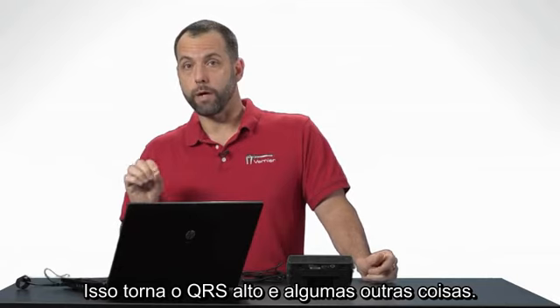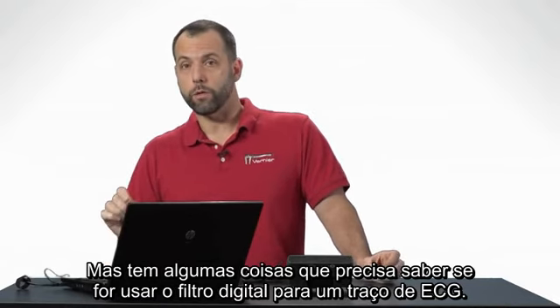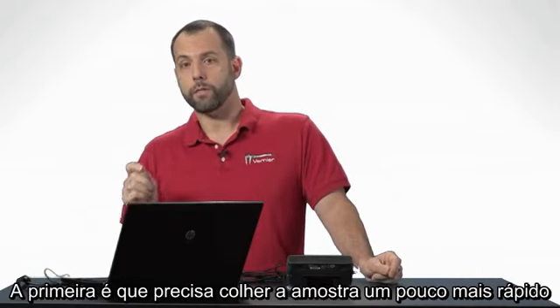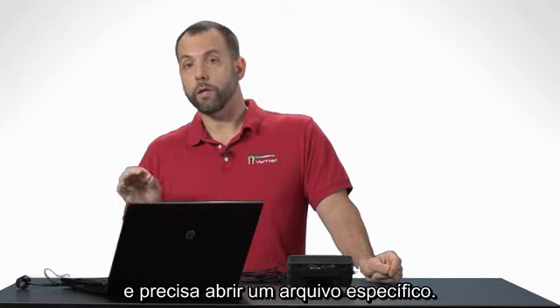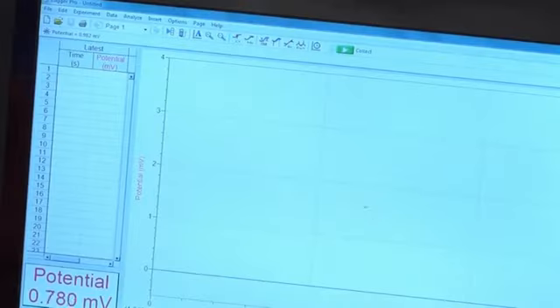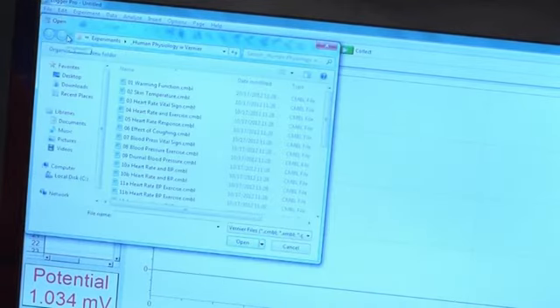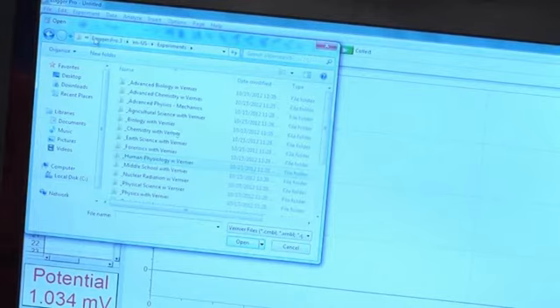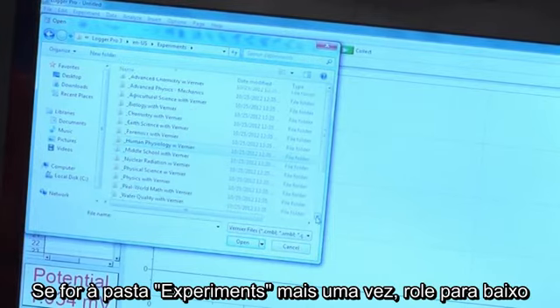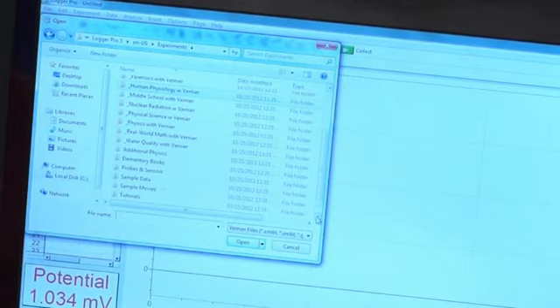That's to keep the QRS peak high and to do a few other things. But there's a couple things you need to know about it if you're going to use digital filtering with an EKG trace. Those key things are you need to sample a little bit faster and you need to open up a special file. And that file is located in a special folder. So if you go to File, Open, and if you go to the Experiments folder here once again, just scroll down until you get to the folder called Probes and Sensors.